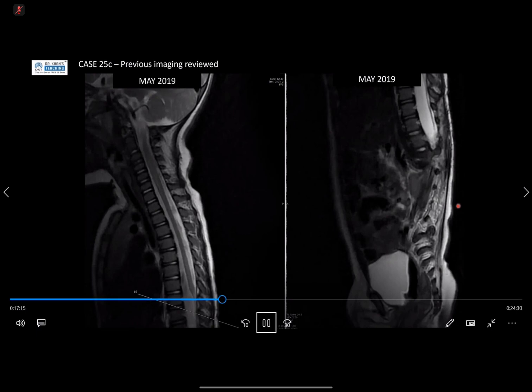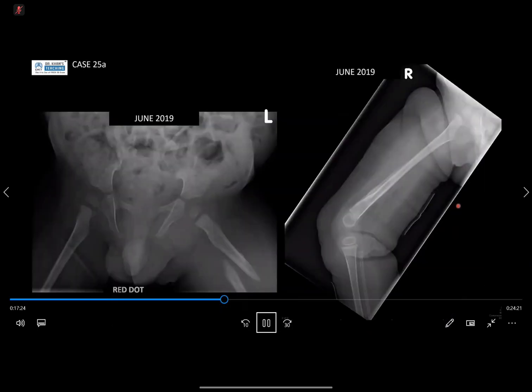So are you still going with pathological fractures? Sorry, it's a difficult case. Essentially, what I was trying to show you was on the line of insufficiency fractures. Let's go back to what you said. There is no metaphyseal lesion here. Yes, there's a little bit of irregularity here. I just wonder whether it's due to his position or whether this could be some sort of heterotopic ossification from some other cause. But the metaphysis is clean, your epiphysis is clean. I think the diaphysis is probably a bit projectional because he's not quite centered. It's a bit rotated.